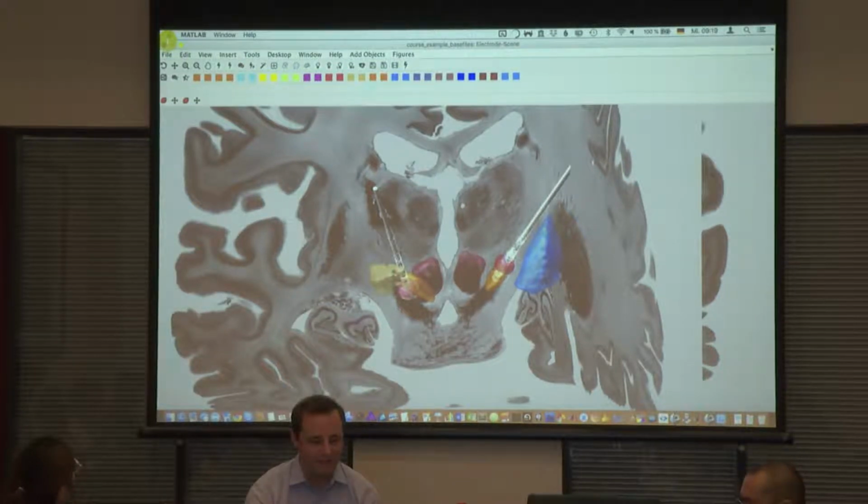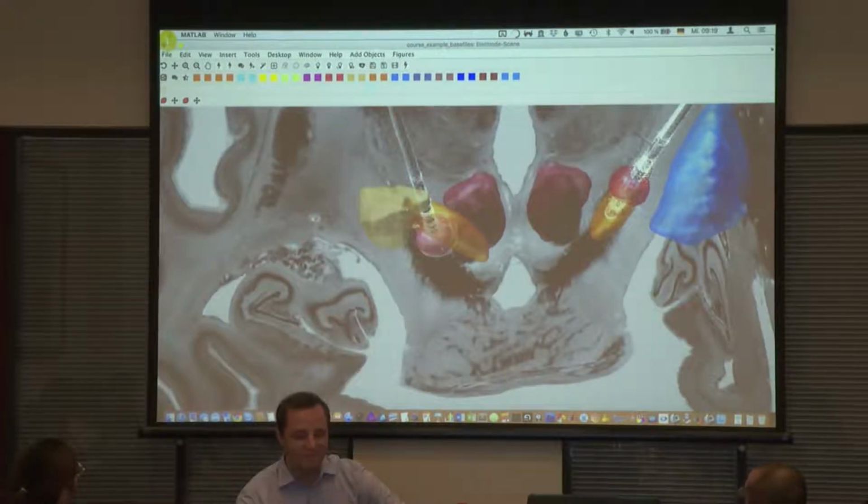For example, here the red nucleus in red. It's all a bit slow now because of this backdrop that I loaded, but you can see the labels now here. And that's about that, I think.